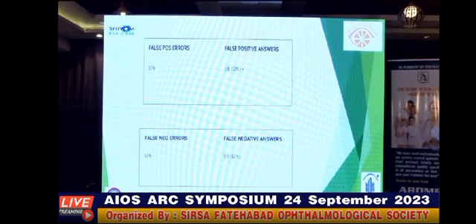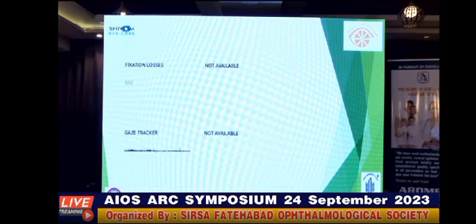Both the Humphreys and Octopus display the percentage of false positive and false negative errors. Octopus additionally presents the absolute number of answers and the total number of catch trials. The Humphrey uses the Heijl-Krakau method to determine the percentage of fixation losses. Humphreys record the eye movements using the gaze tracker, whereas in the Octopus, they prevent fixation losses by using fixation control, in which the test is interrupted when adequate fixation is not maintained.